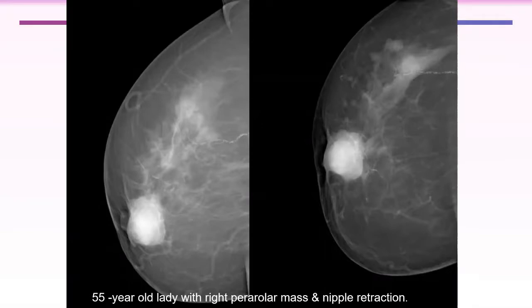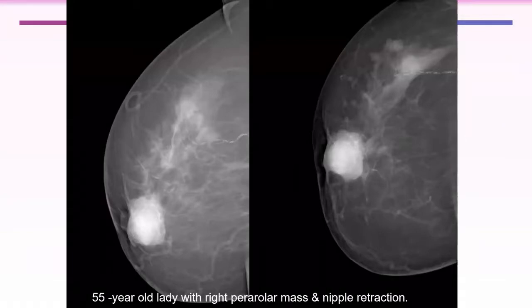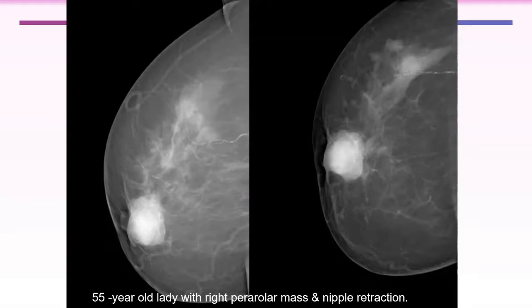When you have a lesion, you should look for other lesions. Is it a single lesion or multiple lesions? Is it important or not? Yes, it is important. There is a density or area of asymmetry, but I think it is part of the breast parenchyma.